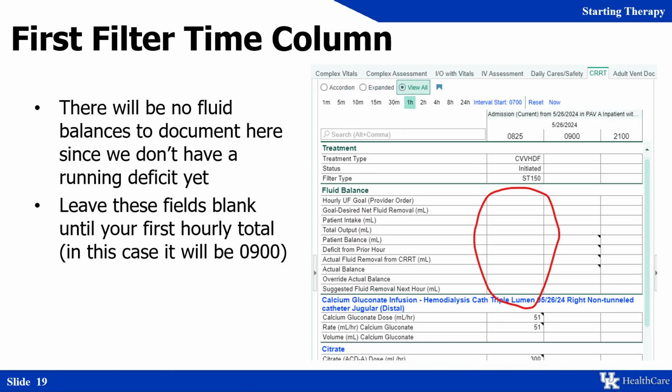For this first initiation of therapy filter time column, there will be no fluid balances to chart because this is hour 0, minute 0, so just leave these blank.